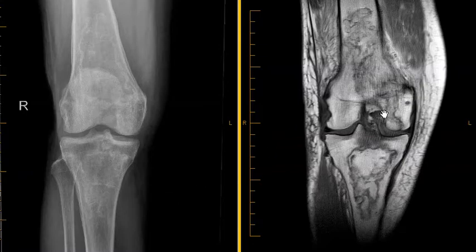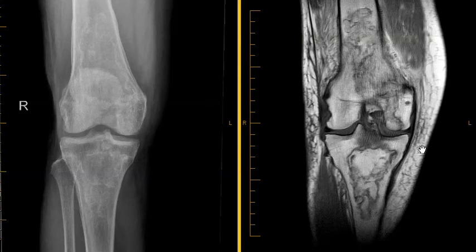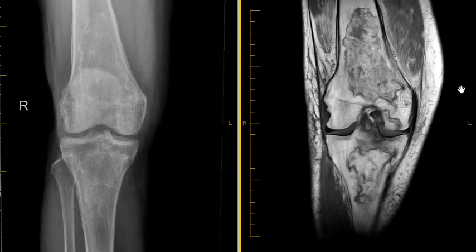It would be unusual to have it above and below the knee, but that can happen in the hip sometimes or in the wrist. But in the knee like this, we think mostly about steroid therapy or other medicines, and also alcohol abuse. So they're going to have to talk to the patient and find out if they have an underlying cause for this. This is a case of osteonecrosis.